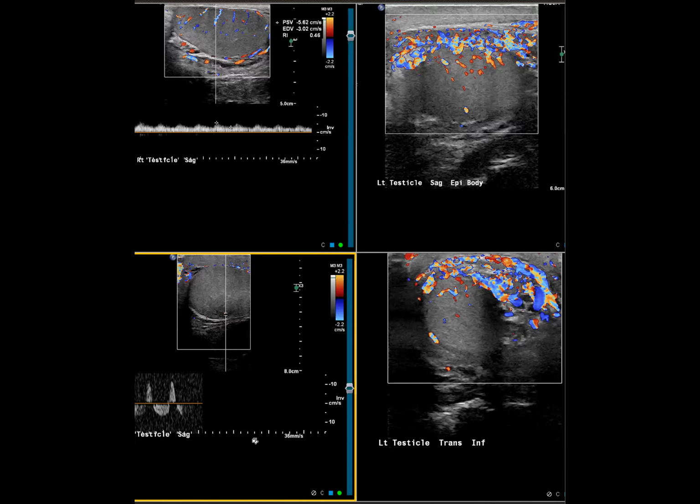And since epididymo-orchitis is more common compared to torsion, common things being common, I would think also of epididymo-orchitis, but only based on imaging, because many times we do not have the clinical data, and we can't completely rely on the history provided by the ED, and we don't go and see the patient ourselves. So I'm confused about this basic but very difficult question.